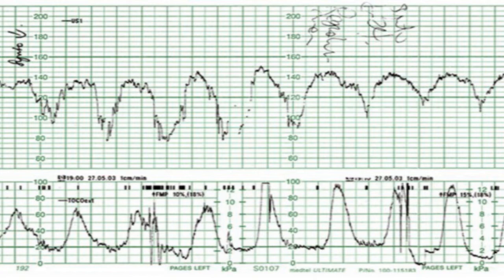Okay, we'll define the risk. We have 4 contractions every 10 minutes. Baseline heart rate is 140. We have here decelerations facing every contraction. And this deceleration starts after the end of the contraction.